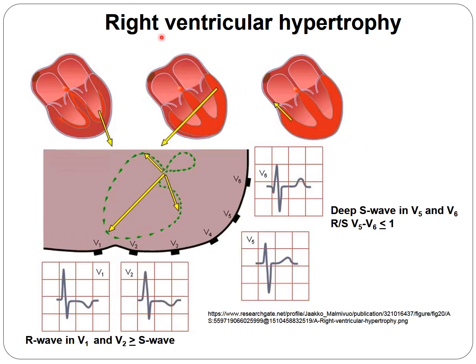When we look at right ventricular hypertrophy, to see how the QRS complex looks in the chest leads, we can look at the vectors, how the chambers are activated. First, we have the left ventricle activation. After, we have a very tall, very big vector pointing to the right, and in the basal area of the right pointing up.